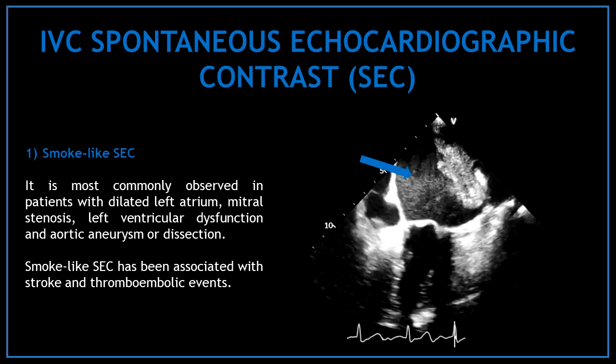Smoke-like spontaneous echocardiographic contrast is most commonly observed in patients with dilated left atrium, mitral stenosis, left ventricular dysfunction, and aortic aneurysm or dissection. Smoke-like spontaneous echocardiographic contrast has been associated with stroke and thromboembolic events.